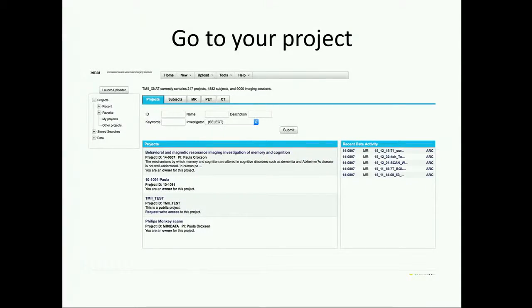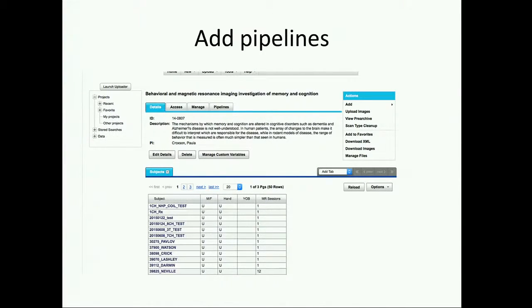So this is really the first part of checking your data. You really should check that it's in XNAT. And no one else is responsible for this other than the person whose project it is. So no one else is going to do this for you. So you can find your project in the Projects tab here, and then there's a list of your projects that will appear below after you've logged in. So to have a look at the data that are in your project, just select the project. Again, if you want more info on this, you can go to the previous workshop.